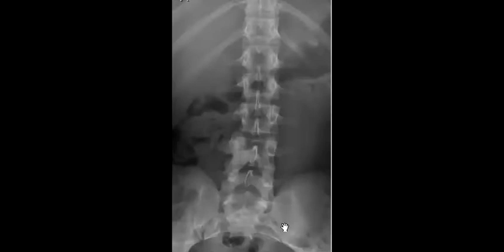And we can consider it not obvious. I mean, you have something here. I agree with you. According to the pedicle of L4, yes. So what could it be? Can you give any differential? Okay. Yeah, it can be mets. What else?